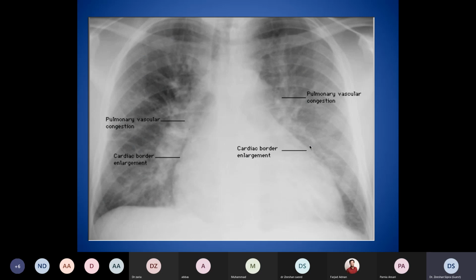I could jump to the pathologies, but for me, there is really very much importance given to these anatomical parts which I showed you today regarding the mediastinum and the borders of the heart. Then I'll move on in the next session to the pathologies, because I feel most of the colleagues here would be more interested in different cases where we can appreciate what the pathology is. It would make it more interesting. What do you say?